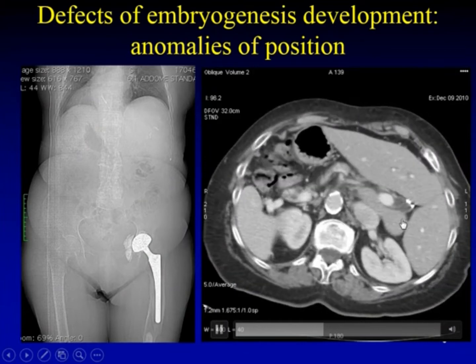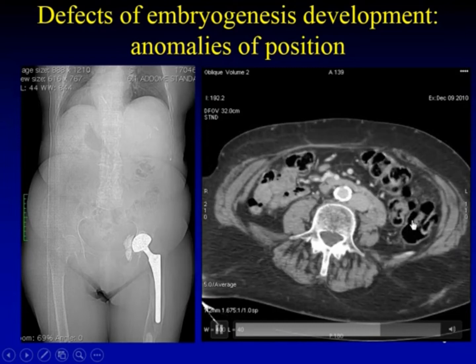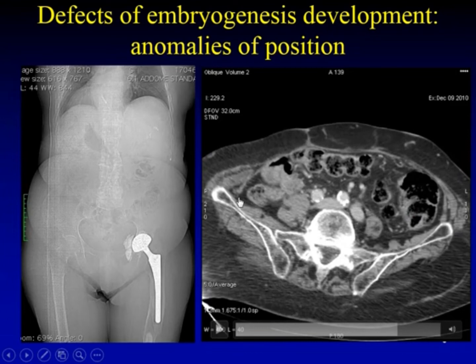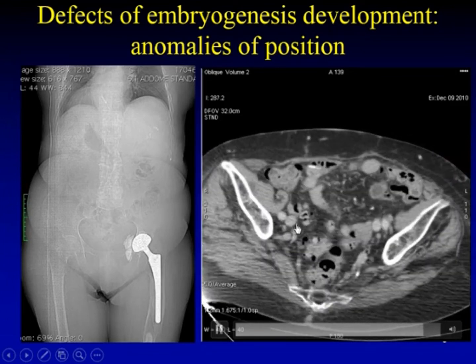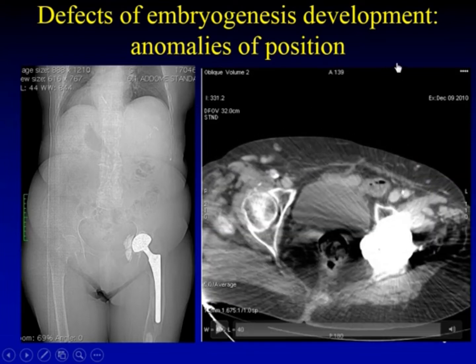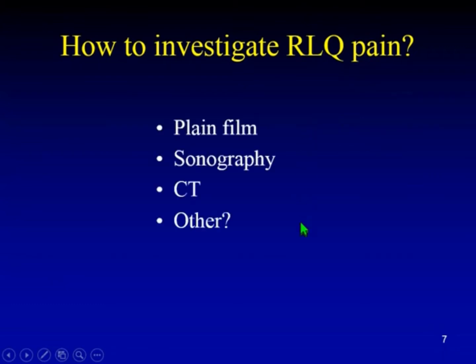In this patient, we may find, obviously, a different anatomy because the cecum is not in the right lower fossa as you would expect, but is left-sided, and on the right side, we may find just this long, redundant sigmoid colon. For this reason, please make sure that the anatomy is normal in your patient before any other choice. We may investigate right lower quadrant pain using all our armamentarium. We will speak about MR imaging, why and when more particularly.